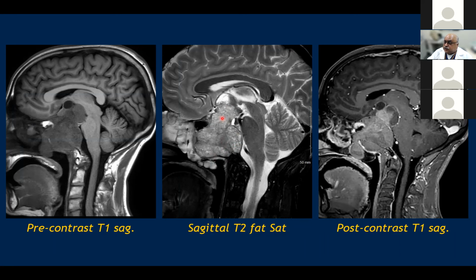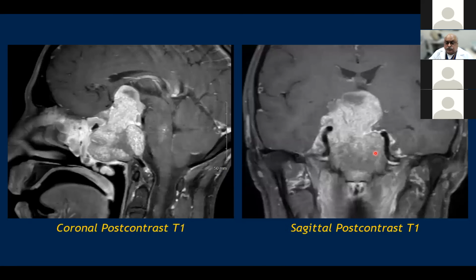And this tumor was more enhancing in this location in the suprasellar system. There is this faint preservation of the clivus, which was present here. So with the destruction of the sella and involvement of the clivus, the primary aim is to note that this was actually arising from the sella.